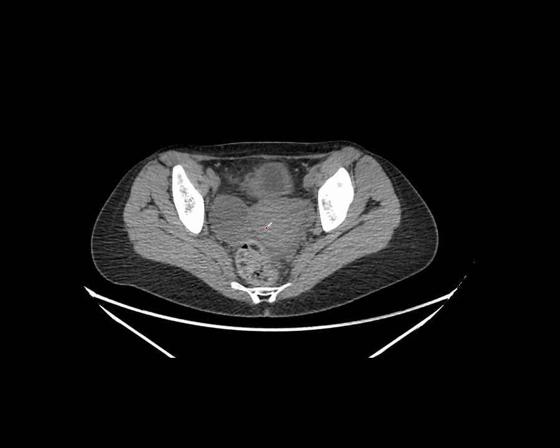Because the patient is going to have treatment and because the size change has been so rapid, we're not really very concerned about it. And the patient did have a post-treatment PET scan after their lymphoma when it had completely regressed. I'm just going to show you what the PET-only appearance looked like. Here we can see that follicular cyst, just a little bit of peripheral activity and central photopenia, very much in contrast to the appearance we had with the corpus luteum. So that's what we would expect for a benign follicular cyst.